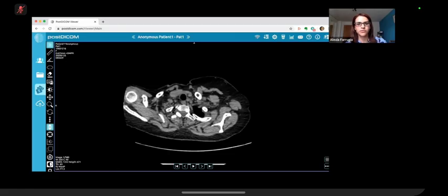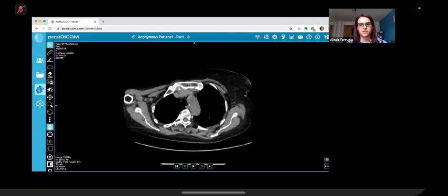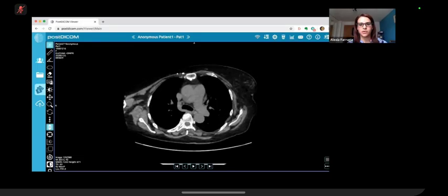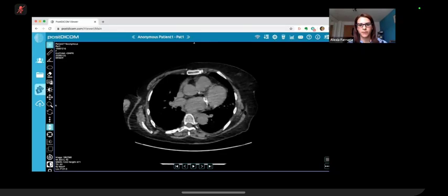So I will scroll through this slowly. So focus on the mediastinum.